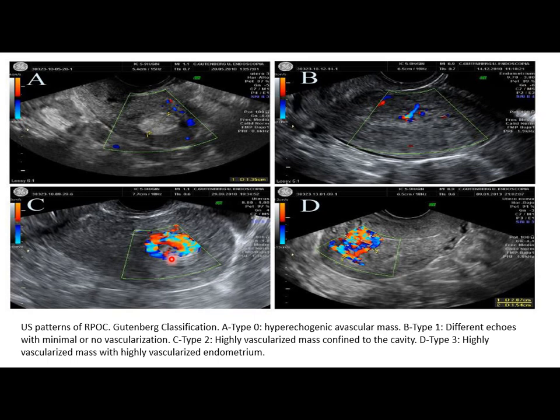Can you repeat it again, please? To differentiate between AVM and retained products of conception: in AV malformation, there is hypervascularity within the myometrium, not within the endometrial cavity. While in retained products of conception, there is abnormal vascularization within the endometrial cavity. So if it's only within the endometrium, it is retained products of conception. If it is both myometrium and endometrium, this is more in favor of arteriovenous malformation.